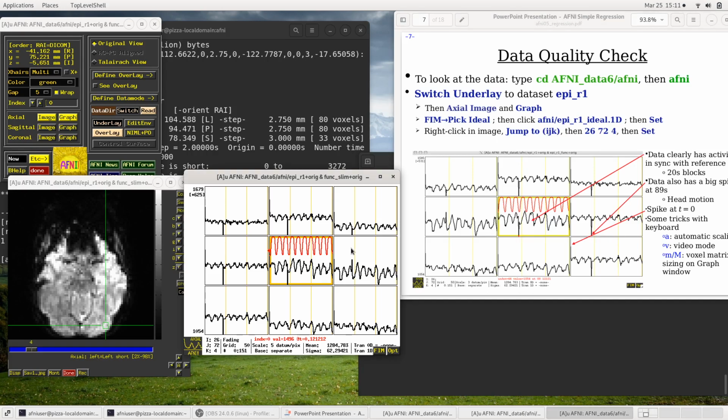So now we want to just focus on what's interesting. Spikes are interesting. Spikes have a big impact on any analysis that we run. And if you notice, many of these voxels start with this big spike in the very beginning of the run. And what is that? That's generally because the scanner hasn't reached steady state for the magnetization yet. So especially time point 0, the first volume is much brighter than the other ones.